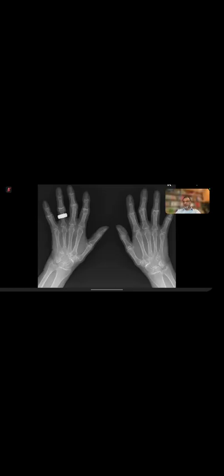Distribution is the same, but look for two things. STT joint arthritis, you can see it here, and also on this side. A patient can have one of these or both of these, STT or first CMC arthritis, and look at the gender of the patient. Mostly these will be females. I cannot explain why it is more common in females, but it is seen in females.